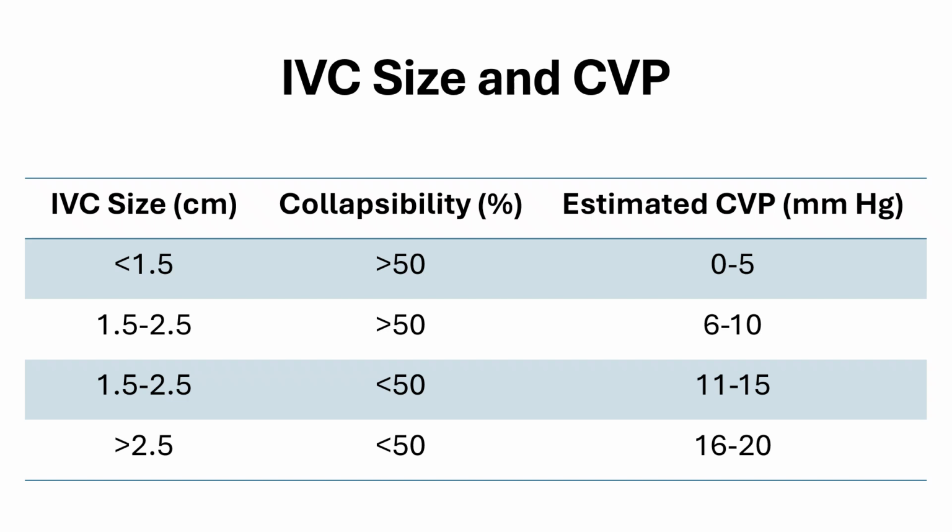Like mentioned earlier, the size and the collapsibility of IVC is quite often used by our cardiology colleagues in estimating central venous pressure. Please take a moment to review this slide and compare different sizes of IVCs and collapsibility and respective estimated CVP.